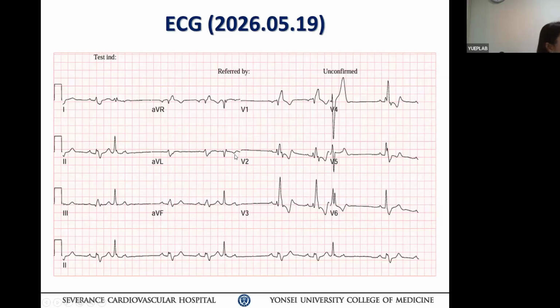Oh, I'm twisting your heart now. Okay, and then look at aVF. It's the same, huh? You guys believe the same. There's a certain difference there, it appears a little different, but you always need to ask that question. This is because of a premature ventricular beat from the conduction system, peeling back into the AV node pretty quickly. Can you modulate the sinus node, or is it an ectopic beat from somewhere?